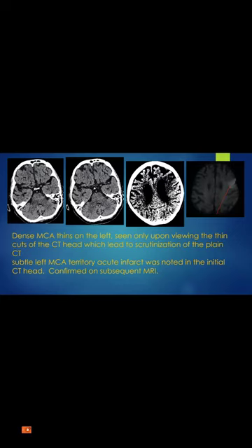Again, windowing. This is an old patient with white matter disease because of small vessel disease. But here we have more than that. We have a larger area of cortical-based hypodensity that is easy to miss if you don't do proper windowing.